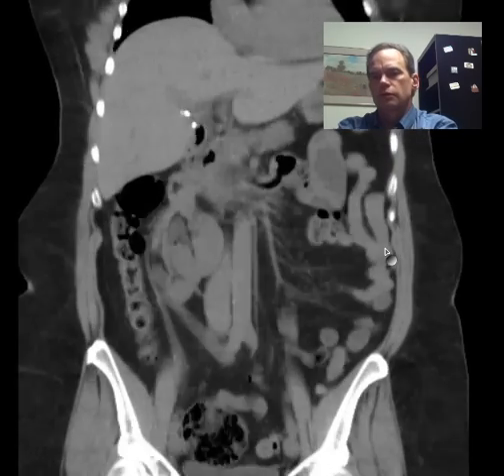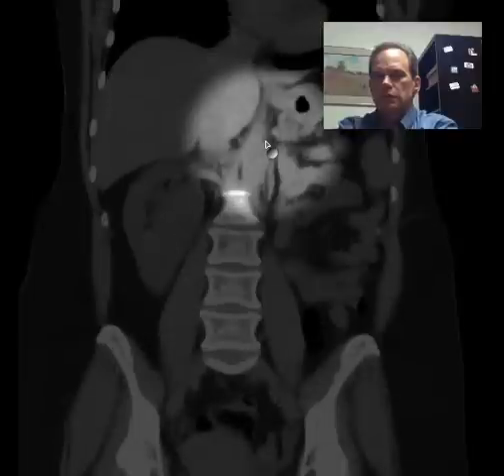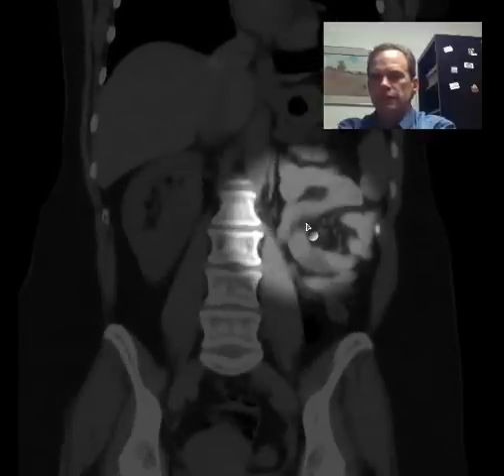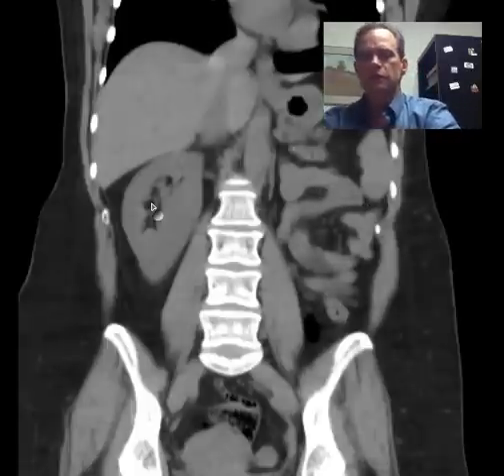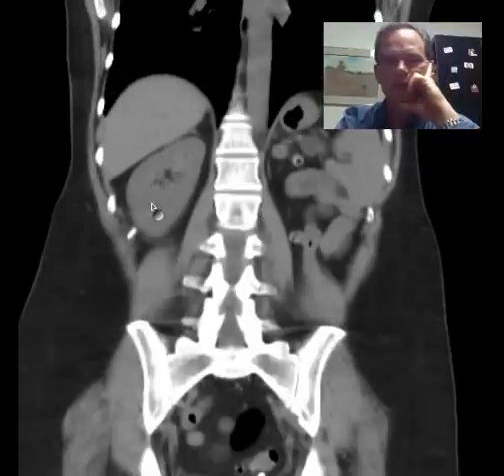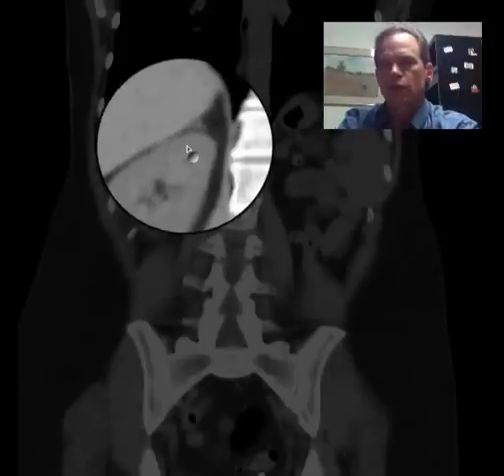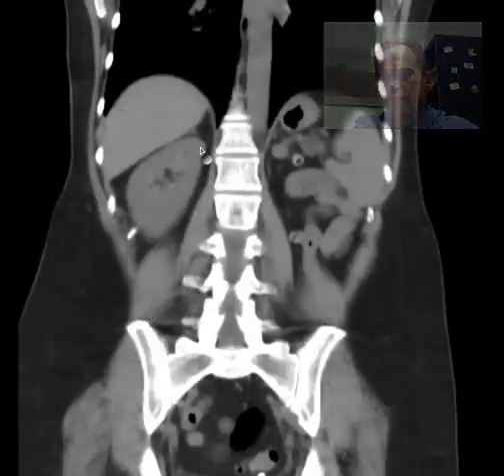So, something's wrong. And you're saying, well, either he's got one funny looking kidney, or he's got one funny looking kidney and an even funnier looking kidney over here on this side. But no, that's bowel, and this is kidney. But what in heaven's name is wrong with it? Well, let's look at it more closely. Let's start and slowly progress. Let's say smoothly marginated, okay. Nice thick cortex. So here you have this margin of the kidney right here.